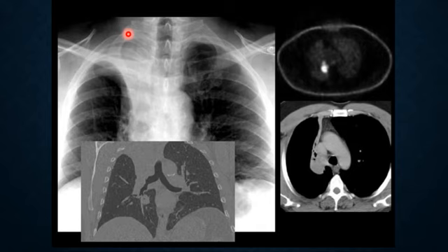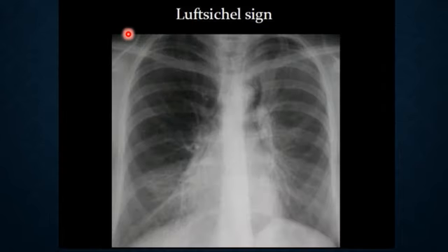Now, the next sign is called Luftsichel sign. Luftsichel is a German word for what? What does it mean, Luftsichel? Translate.